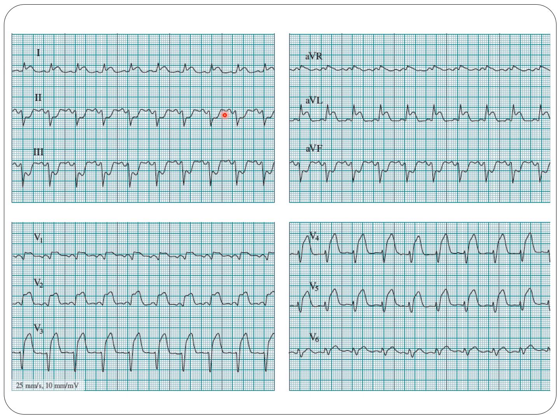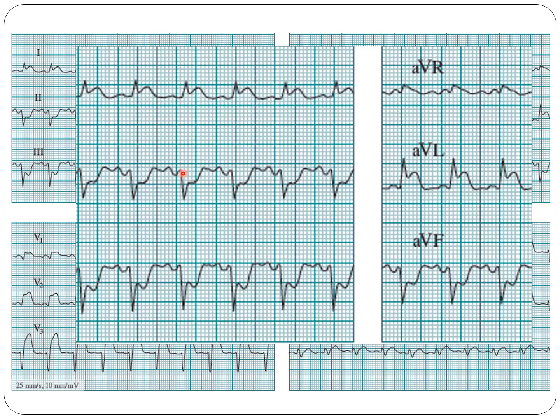The next ECG again is rhythmic. You can see the rate is tachycardic, it's more than 100. The rate exactly, if you count, is 120. Again, we can count 1, 2, 3 seconds, but it's not exactly the same. So it's around 120. Looking at P wave? Yes, we do have P wave, so that's a sinus tachycardia.